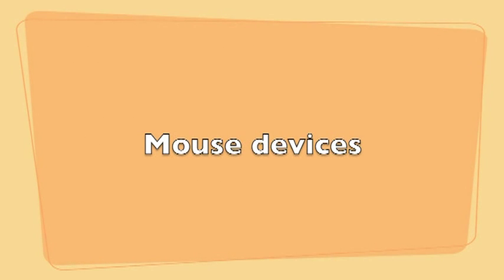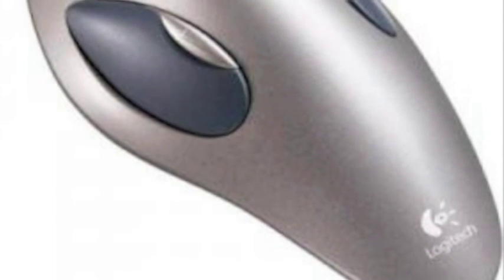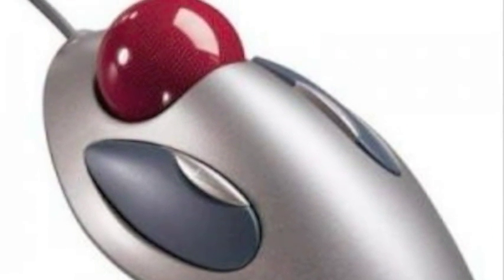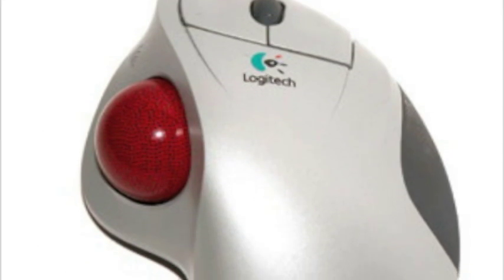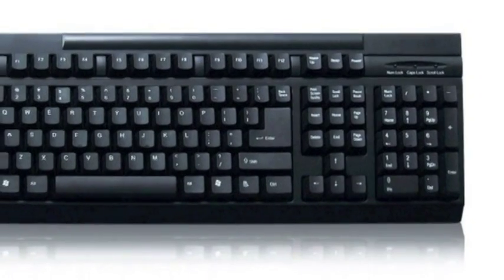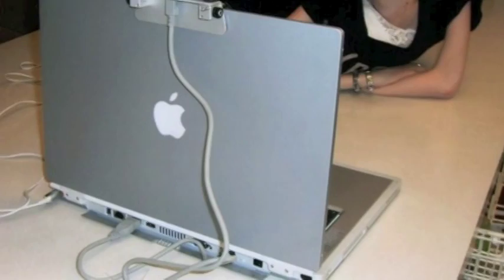If the client is able to use a mouse device, there are a number of devices available. We will compare 3 common mouse devices. If your client is unable to use a mouse, there are alternative mouse devices available that you will explore in the lab, such as the keyboard control, voice control, and the head mouse.